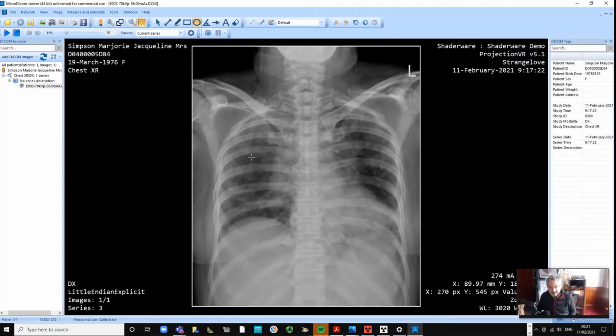over an area of dark lung and an area of rib, but the point is that it has to be reproducible. So for example, if I drew a region of interest here, it makes sense if it's a certain number of millimeters size. You see, I'm looking at the area here. 75 millimeters seems reasonable. So Control C, Control V.